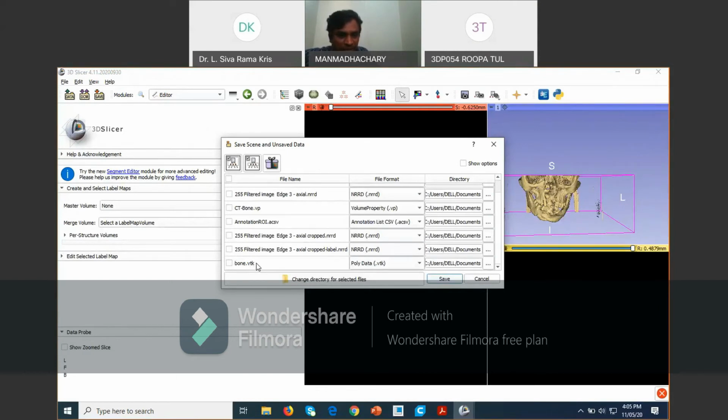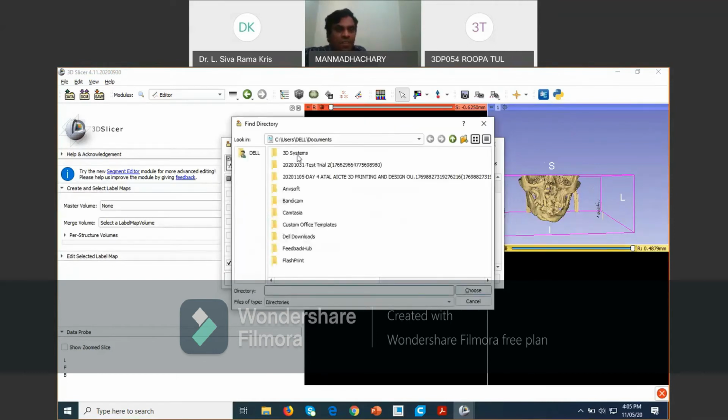Are you seeing my screen? Yes, sir. In this one, you have to choose the different formats: poly data, XML, STL, poly, and .obj file. Okay, then you have to choose the STL file here. Then you choose the save. Where you have to save that, you have to choose it.